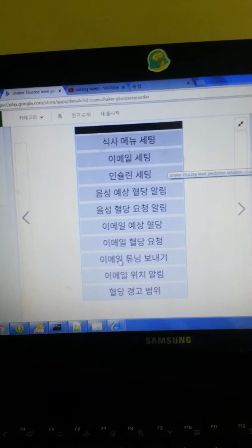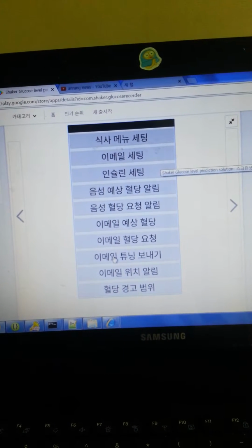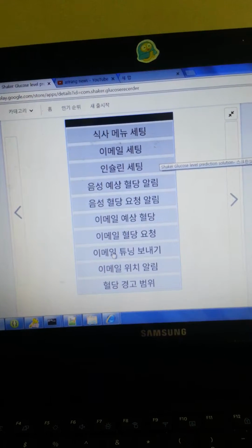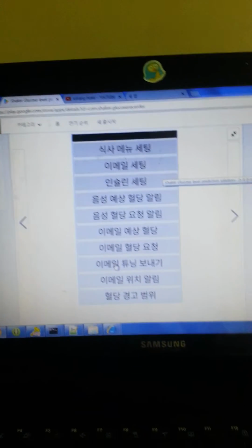And this button means just to send the parameters to your email each time. So if you are not interested in these parameters, it's okay, just ignore this button.